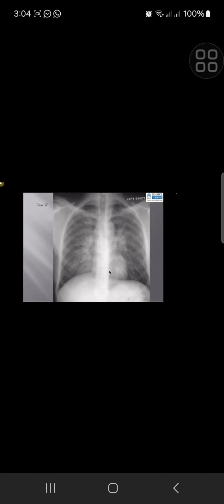Although the cardiac shadow is not enlarged and there's no cardiomegaly, this may not be cardiogenic pulmonary edema, but I would still think about pulmonary edema. However, differentials for interstitial lines such as Kerley B lines can also be malignant, such as lymphangitis carcinomatosis, but it's unlikely in this distribution, especially with the perihilar opacities and the upper lobe diversion. I think this is pulmonary edema.